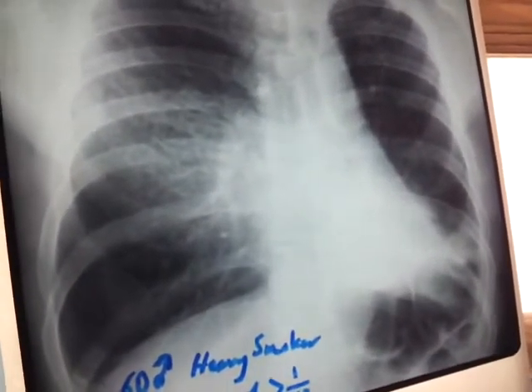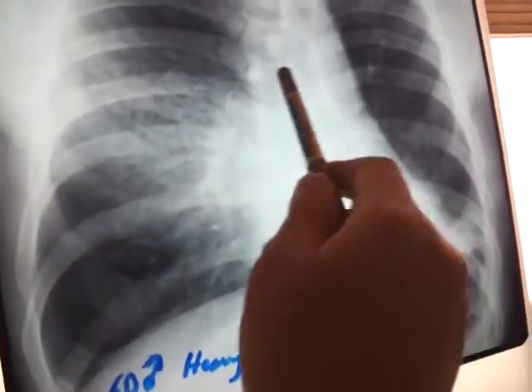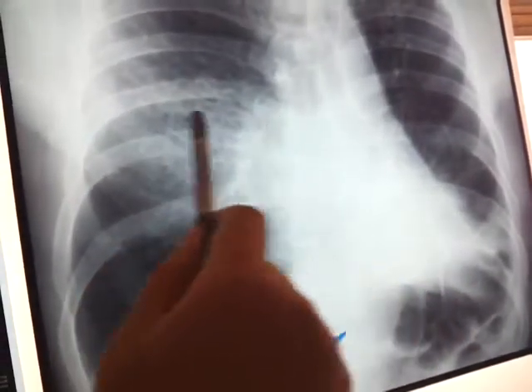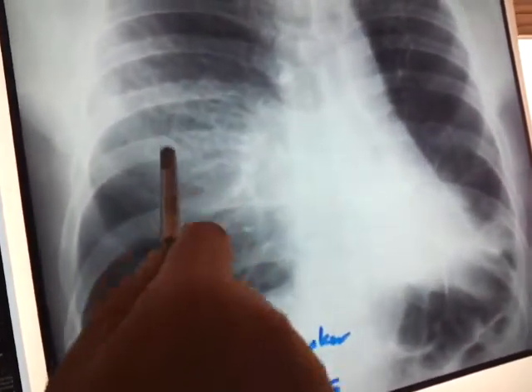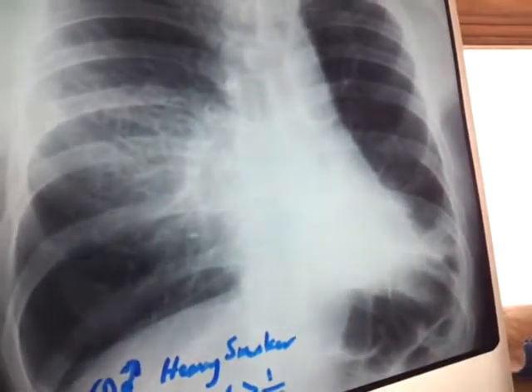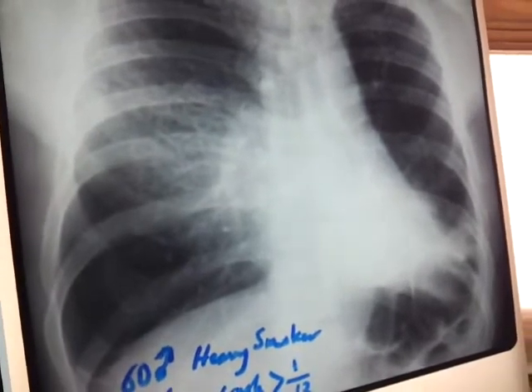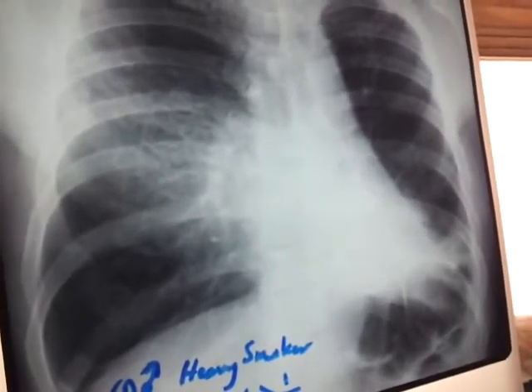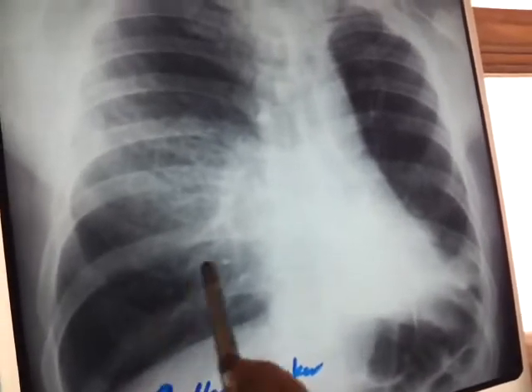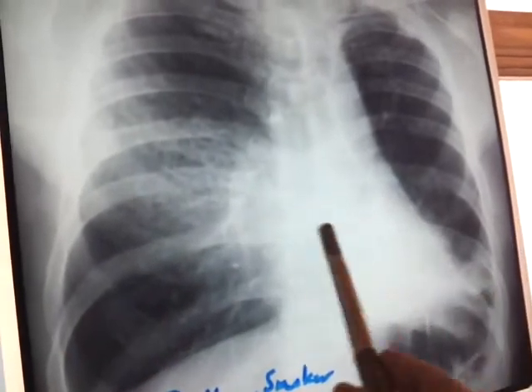Yes, could be tuberculosis. What they call it is lower lobe tuberculosis. This is the hilum. If you get TB below the hilum, this is lower lobe or lower part of the lung tuberculosis. But usually this occurs in young patients, usually below 40. Could be a tuberculous lesion.